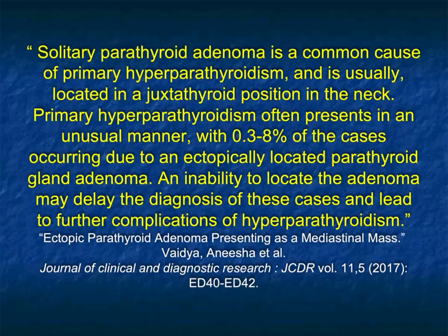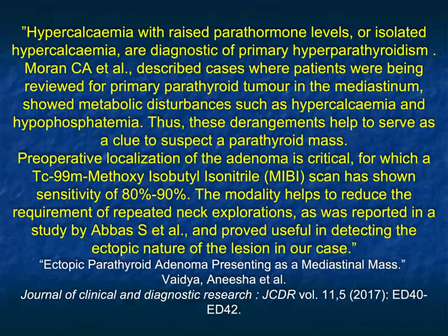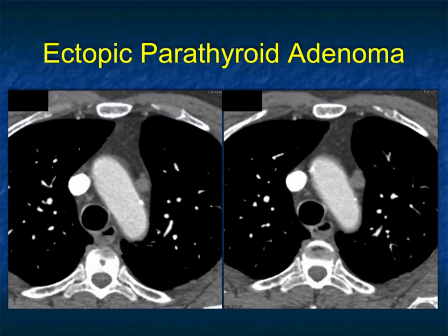You need to find the lesion because going in surgically, if you don't know where it is, it's unlikely you're going to find it. So we talk also about using nuclear medicine studies. We also could talk about MR, but CT is often one of the most successful techniques for being able to find these ectopic parathyroid adenomas.